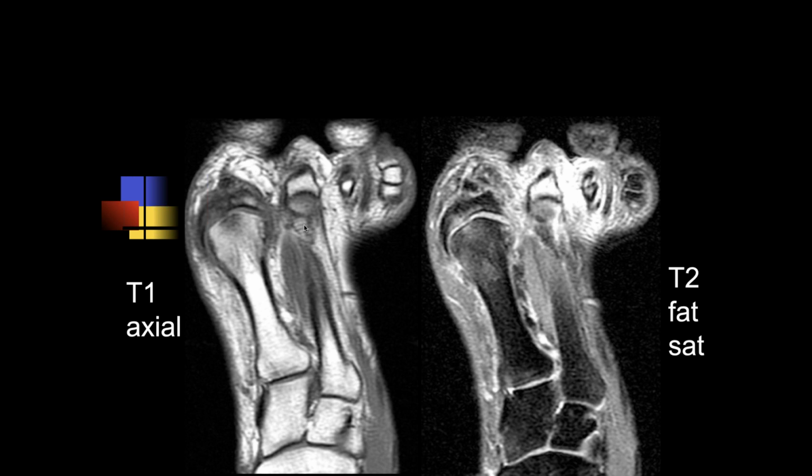Assume that's not cut. Is that just a slice collection, or have they actually had an amputation of that second digit? No surgery. Okay, because it looks like it's going a different direction between the first and the third. There's kind of increased signal surrounding that, in between the second and third metatarsal MTP joints, in the soft tissues. But I don't really see anything there on the T1 axial.